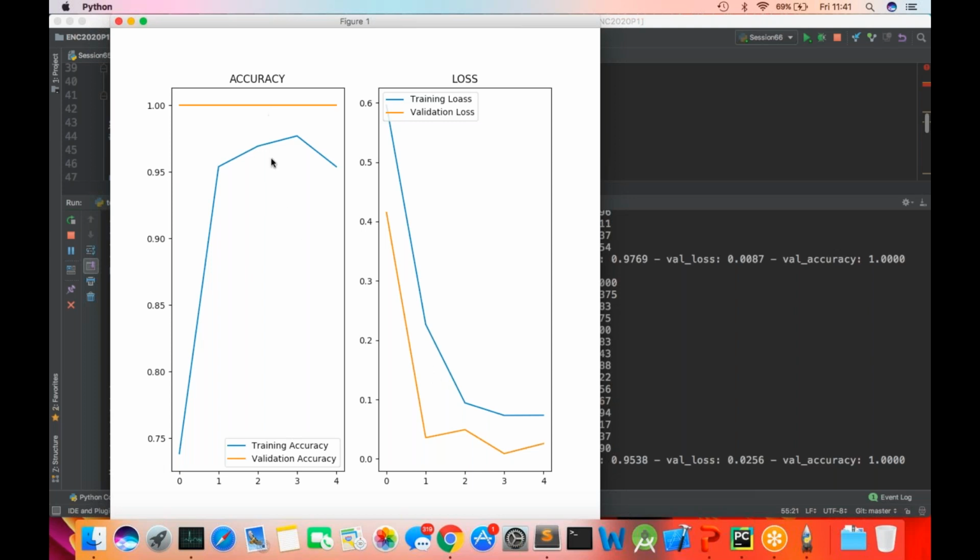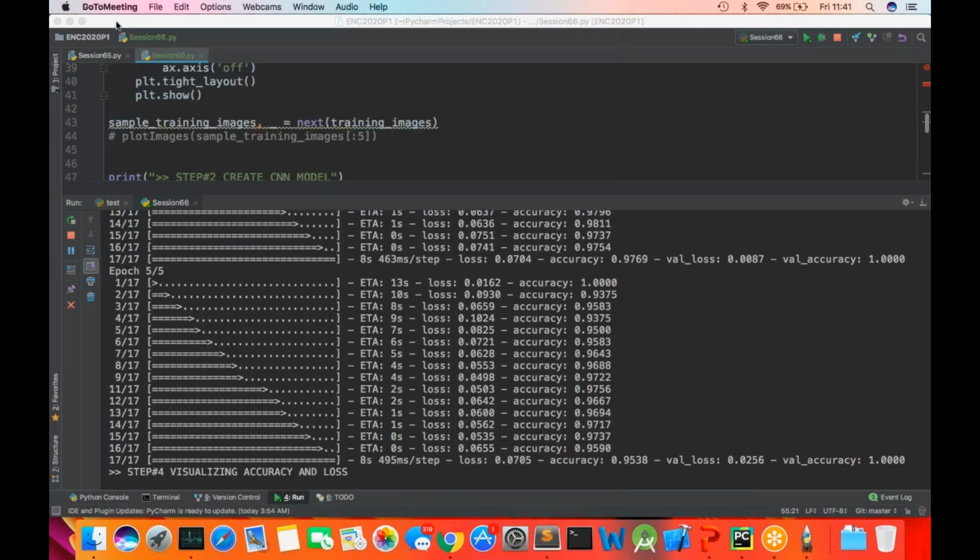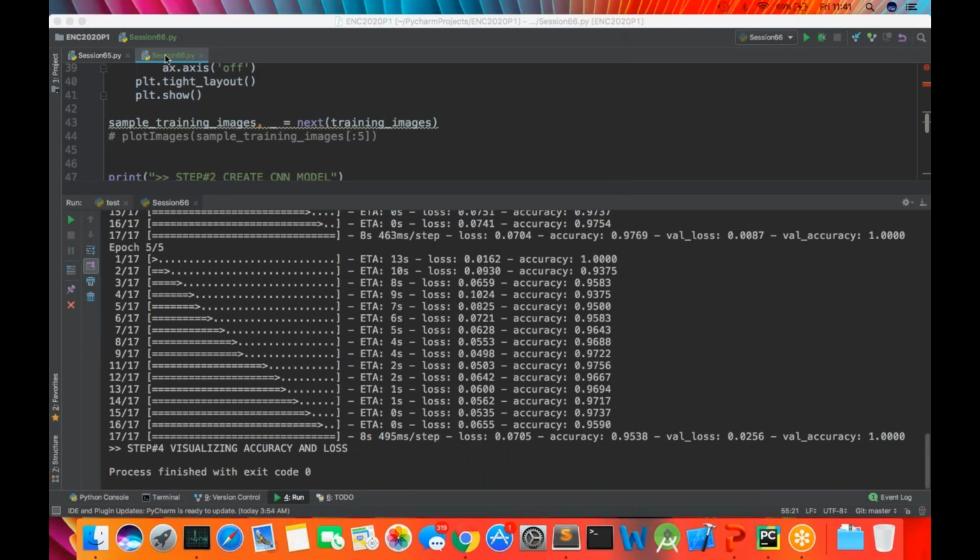So what I see is there is a lot of gap here and gap here. So these two lines have quite a gap. So we cannot think that okay, this model is going to work fine for us. Okay. Now what we should be doing next. So this is the phase 1. This is the first part here, right? So I'll just put up these comments.